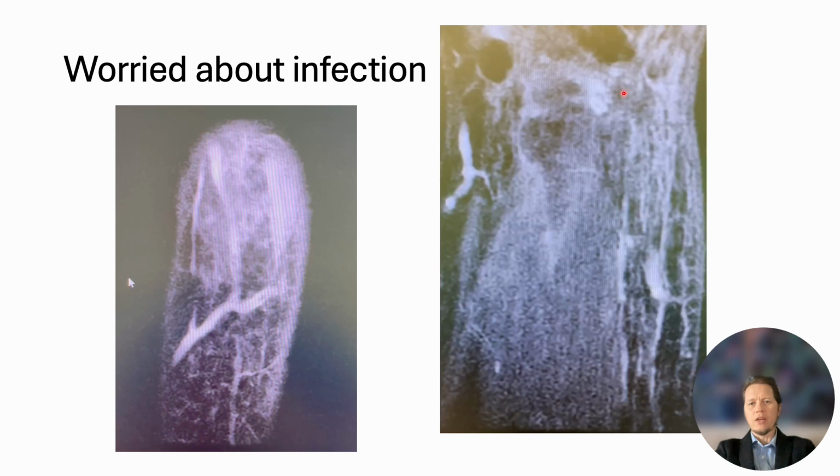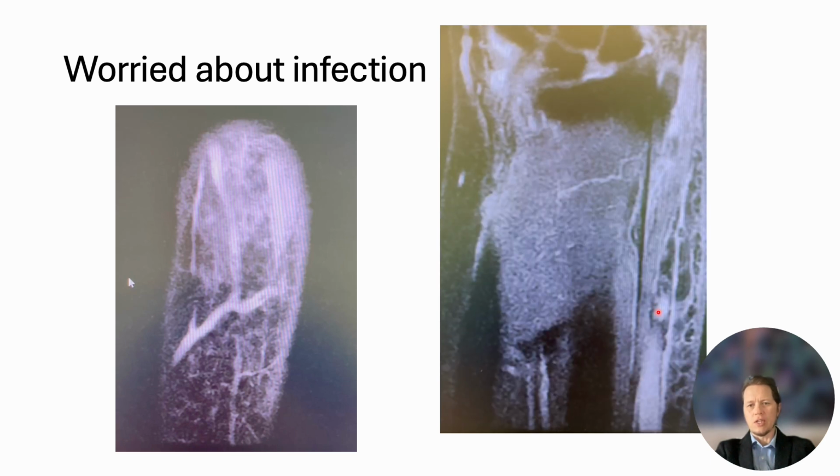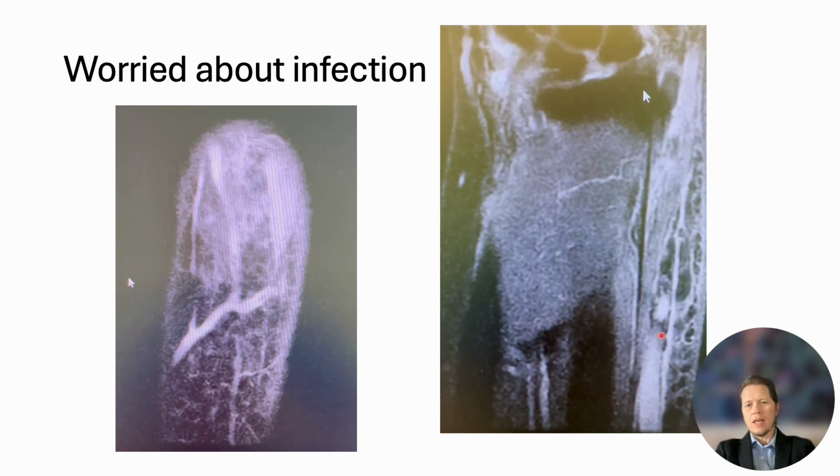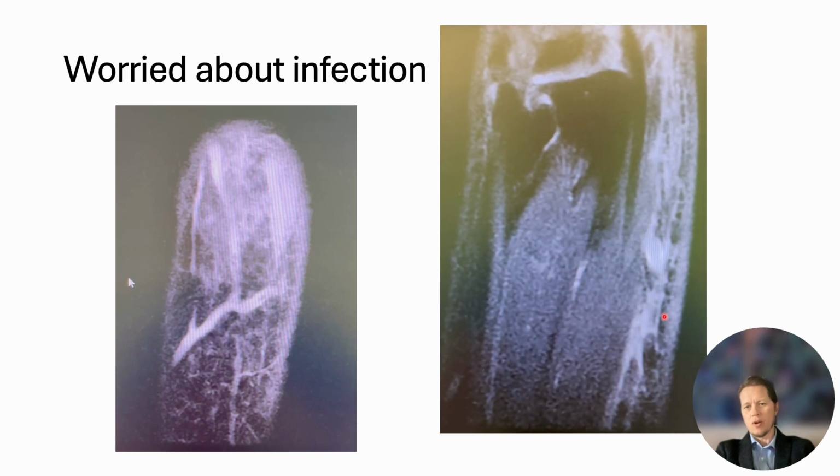Start here. Radial side of the wrist is right over here, and there's a lot of white going along there and a lot of cobblestoning of the skin. And that is a sign of cellulitis, kind of an MRI sign of that. Can't really see the tendons too well.